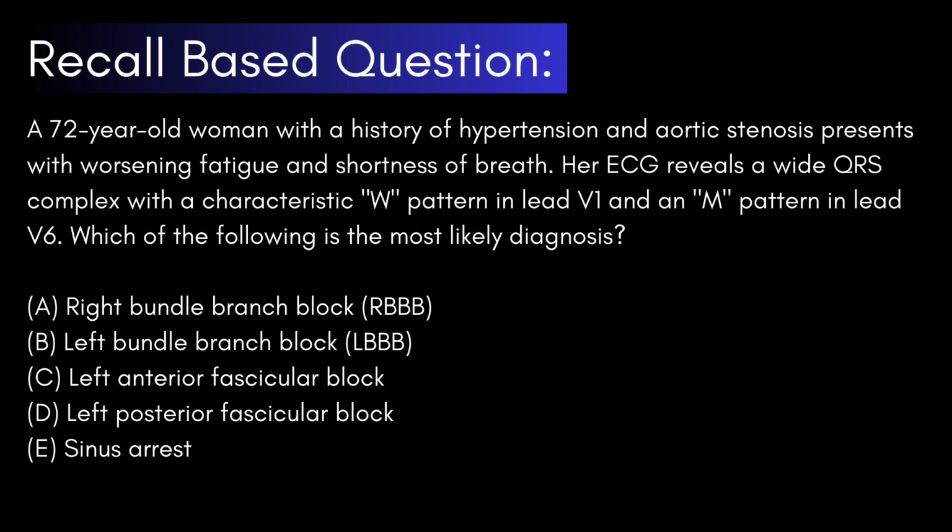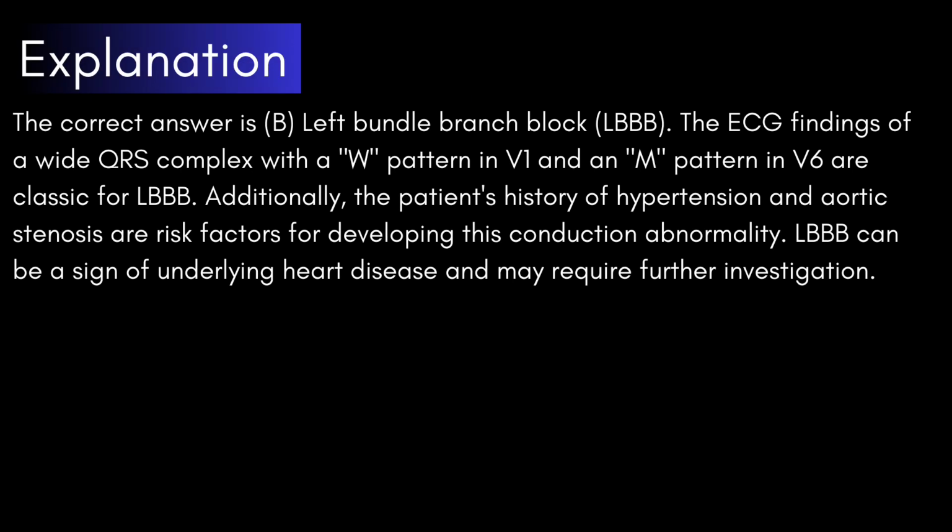All right, I think I gave you guys enough time here. I'm going to move on to see what the correct answer is and what the reasoning behind it is. If you need more time, feel free to pause the video. Otherwise, moving on now. The correct answer is B, left bundle branch block.